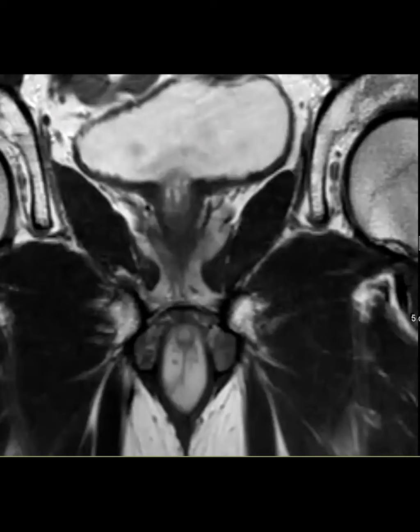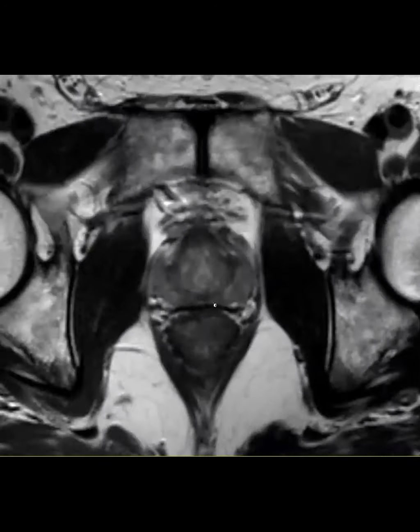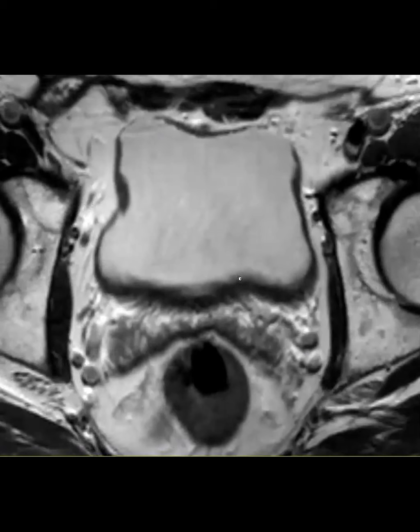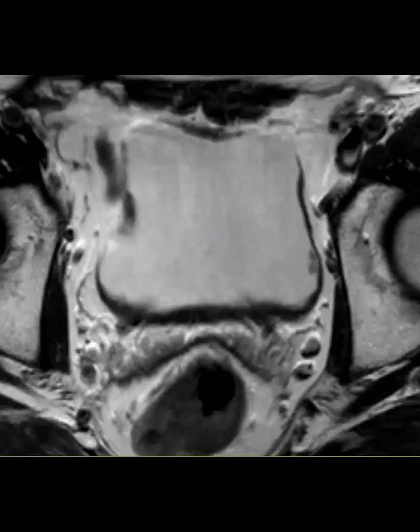This is another quick pat on the back. This was a prostate MRI case. Just a quick reminder that we are responsible for everything on the scan, and check out this tiny little thing.